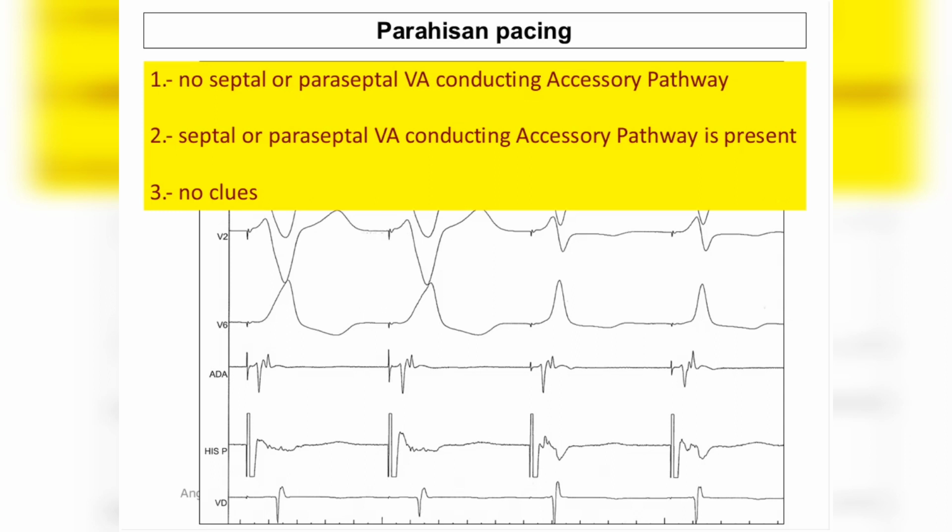Despite having the answers there, you can tell in lead V6 the narrowing of the QRS when you compare the last 2 beats with the first 2 beats. So looking at the atrial signal, what do you think? Now you are voting, and we will see the results here probably in a few seconds, so we can tell what your opinion is about this tracing.